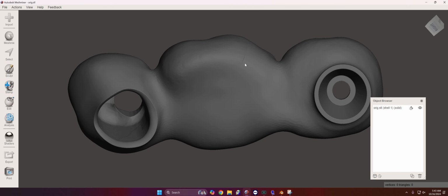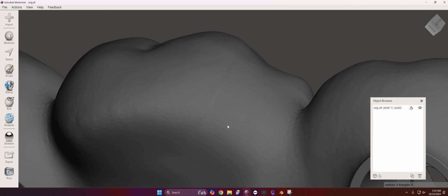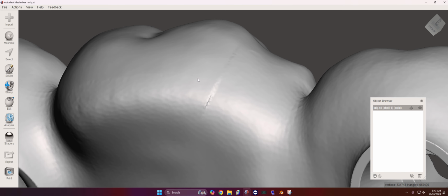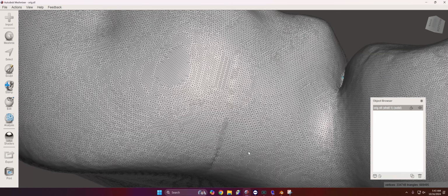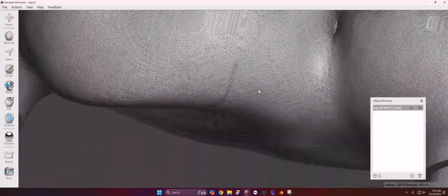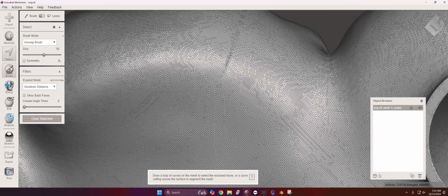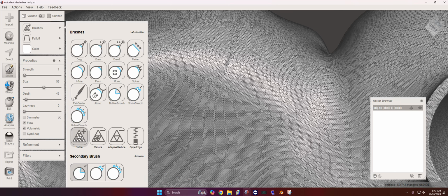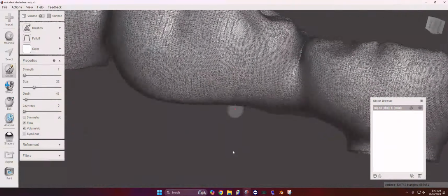Well, you can see rather clearly it's a solid unit, and while we had a little join here, let's go ahead and look at it a little closer. I mean, it's unified. You know, let's take a look at the wireframe on this. Can't be nicer. If you really want to bull it up, we can go ahead and sculpt this with just a little refine here, and turn the power down and come straight through this, and boom, Bob's your uncle, it's done.